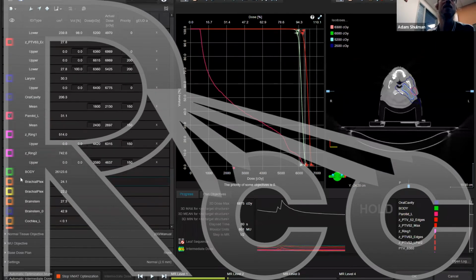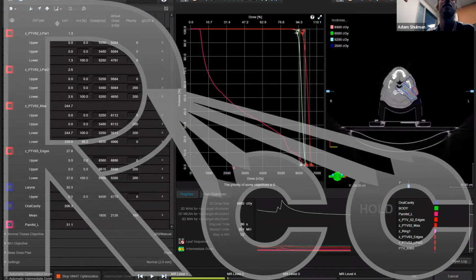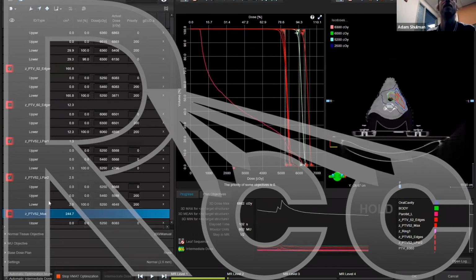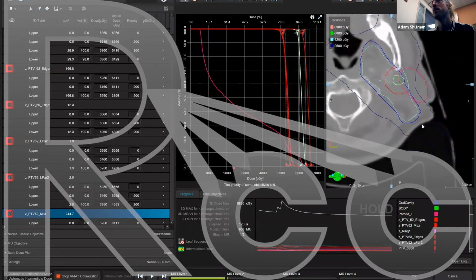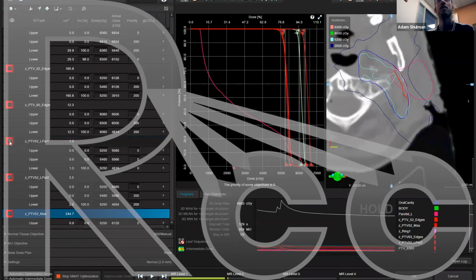So I'll show you this quickly, how this works. The naming is a little messed up again, sorry, but you'll see the principle. Oops, I don't have my 52s on there. Okay, so here's my 52 max. So here I've got these little parotid segments. And because my naming is wrong, I've forgotten which one is which. Apologies. So here's, okay. So part 2 is my full one.